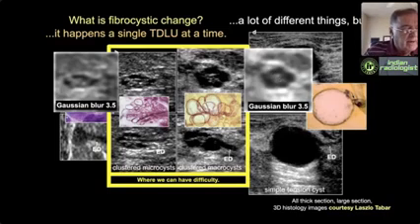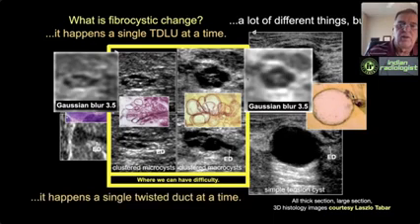So what I found is that with lower end, cheaper ultrasound machines, you can't resolve the microcysts as well. So I don't think you miss cancers more, but with a lower end ultrasound machine that has lesser resolution, you have less ability to resolve the microcysts, which are benign, and come up with a falsely suspicious appearance of a complex cystic and solid mass with either a mural nodule or a thick septation.